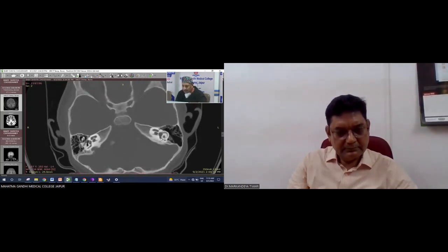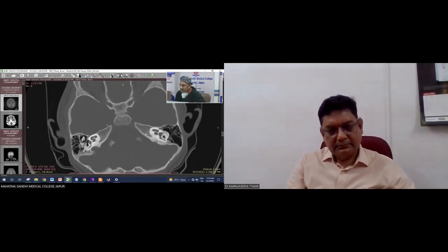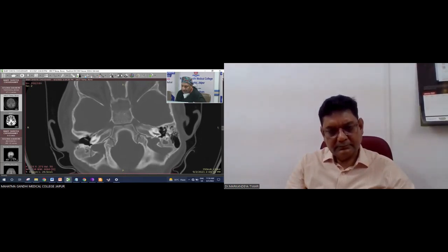That's a different field. I am not going in detail, but this is one of the ways we must look at the CT scan to rule out all those possibilities of cochlear nerve hypoplasia or deficiency. So CT scan has to be seen differently from cochlear implant. Now the another important thing, that the basal turn of the cochlea and immediate anterior structure to the basal turn.